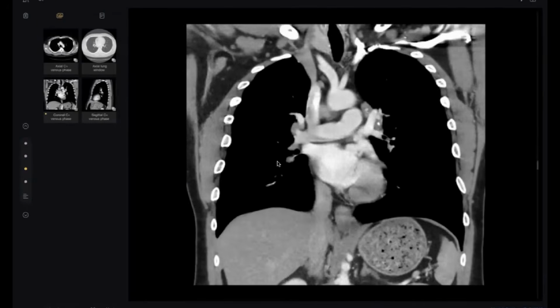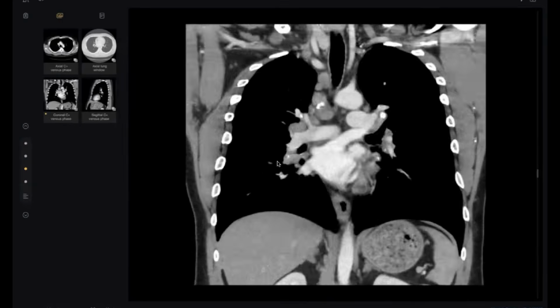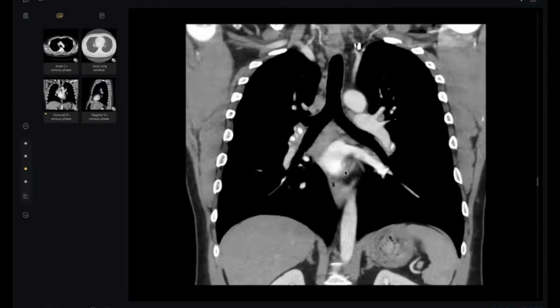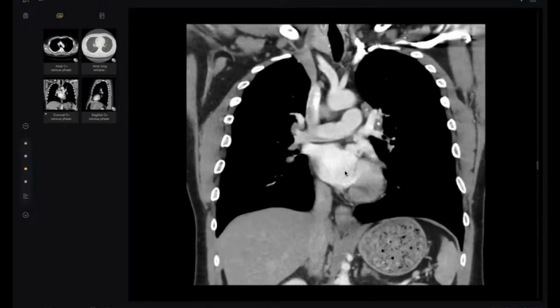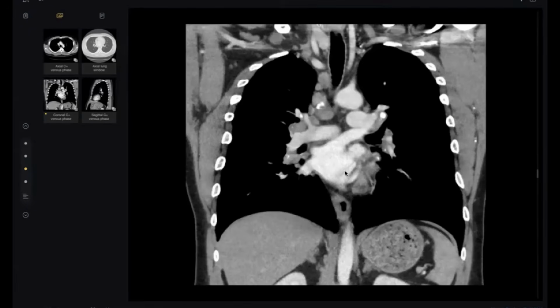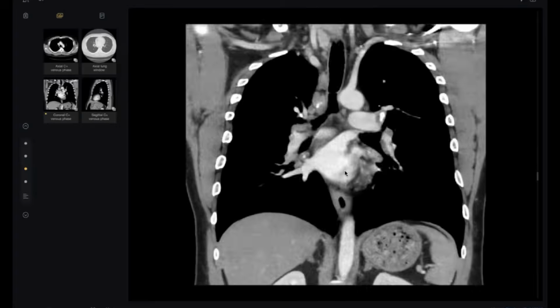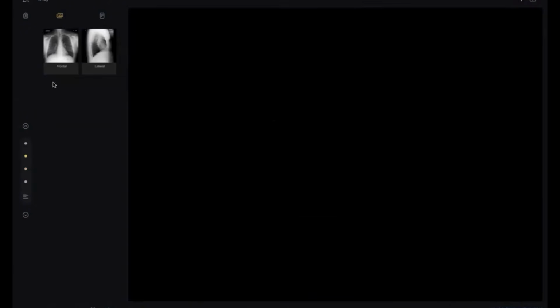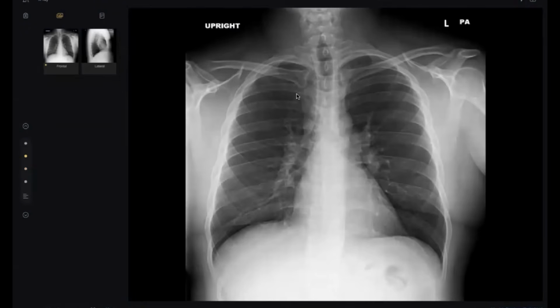Bilateral symmetrical hilar and, as I mentioned, right paratracheal, the 1, 2, 3 sign. The lambda sign is assigned to the gallium scan, but no problem. So a very subtle sign diagnoses a very systemic disease, despite the lung parenchyma being totally normal.